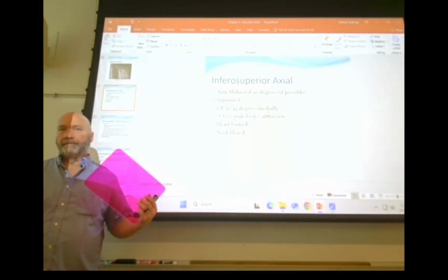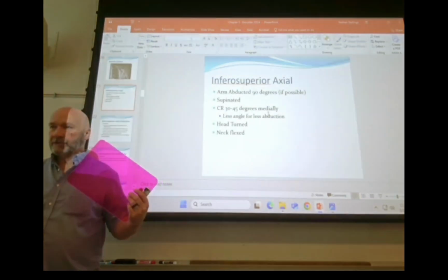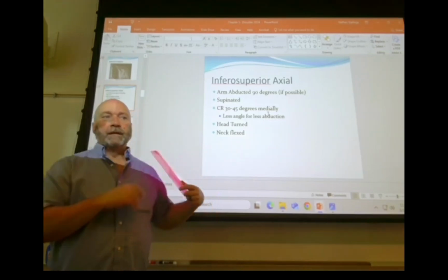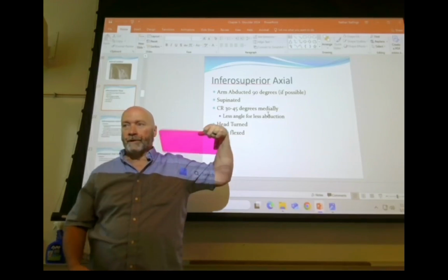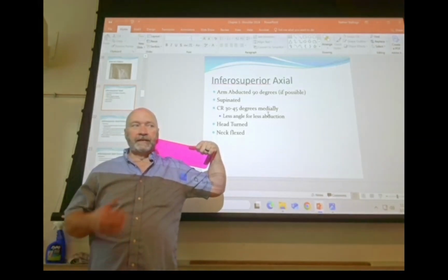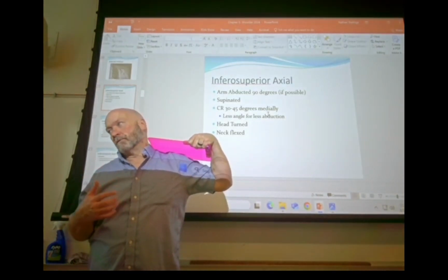One was overangulation, and with overangulation you may project the head of the humerus off the image receptor. And the other gives you the same thing, and that is your positioning. You know, the x-ray beam shooting from the floor here, but the other thing is that the technologist would not have the patient bend their neck over.